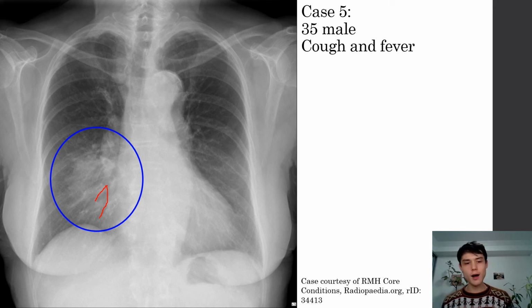So because the heart, the diaphragm and fluid or pus have similar radiographic density, when you have structures that are abutting, then the lung is filled with the pus or the fluid, then you lose that border. So when you have consolidation or pulmonary edema in the right middle lobe, because that's abutting the heart, you will lose the right cardiac border. And similarly, we've seen in previous X-rays where you have lower lobe edema, or equally if it was consolidation in pneumonia, you lose the hemidiaphragms.